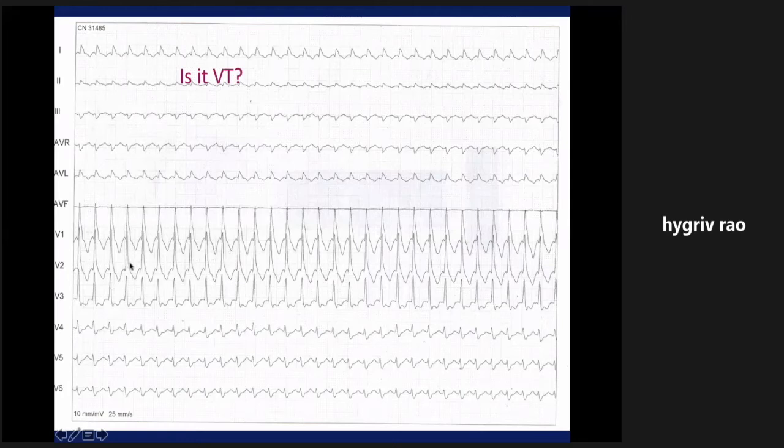Now look at it. What you should see is, when you take any lead like V1, now look at the T waves. You can see alternately, one of them is deep, one of them is shallow. Deep, shallow, deep, shallow. So this should make you suspect that there is an extra wave here whenever it is deep, rather than it just being by chance that you are having an alternate big and small wave. And you see the shape of the wave, suddenly it changes into a very sharp wave. So there's something happening. You should always suspect such things.